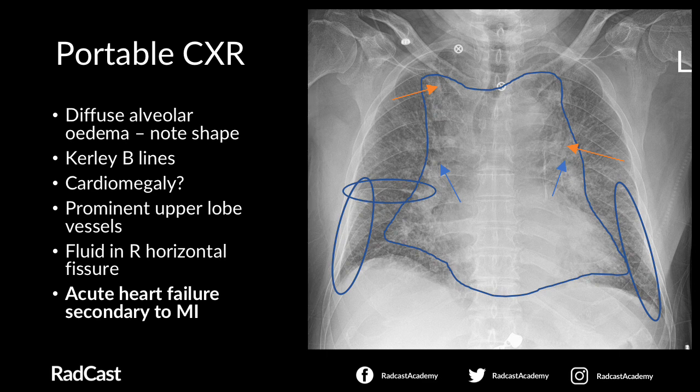What are we seeing this time? Starting again with A, we can see clear alveolar edema here. I've tried to draw this, and it is actually projecting out in a kind of bat wing pattern across the upper, mid and lower zones of the chest x-ray. We've definitely got some clear air bronchograms here, which I've arrowed, which I'd expect to be present with this level of edema. The two ovals at the bases are showing some pretty clear Kerley B lines. They're extending centrally like whiskers, almost from the basal ribs.